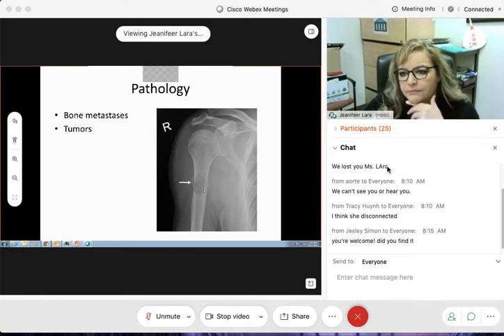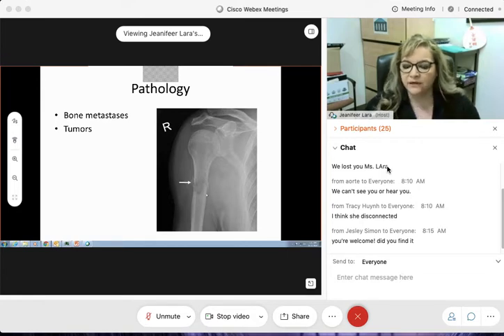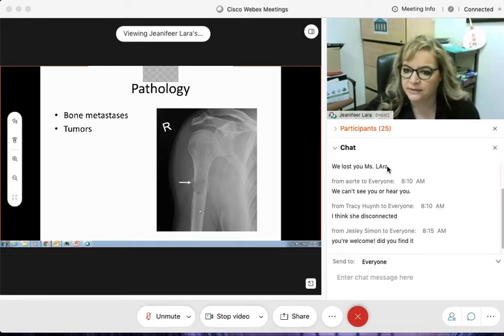Are there any questions? Yes, it would be referred to as a minus density. You see that? You definitely see the brightness go down into darker, and that looks odd. When we're identifying pathology, we're looking for inconsistencies in that brightness. Very good, Marisela.